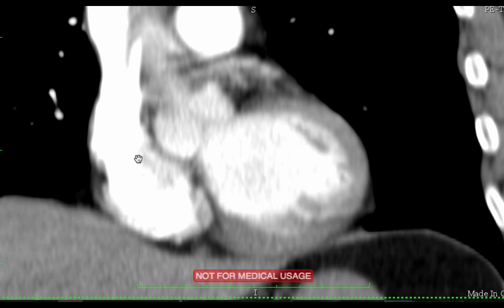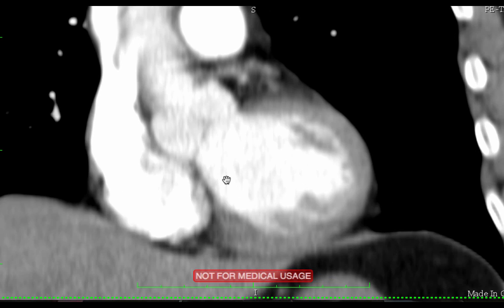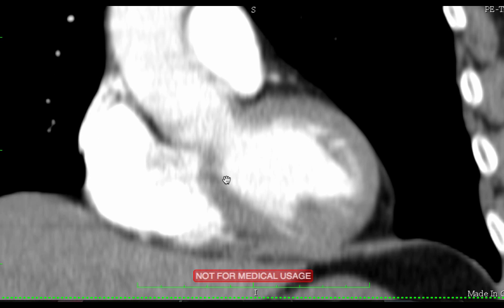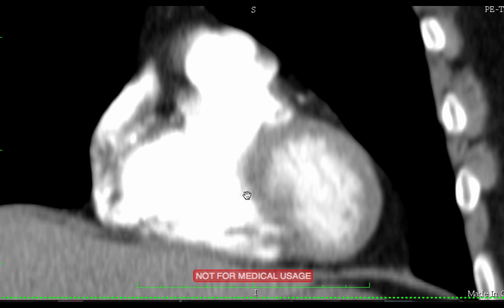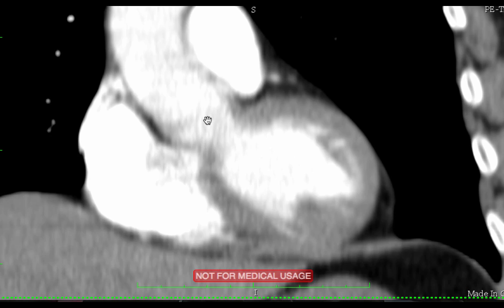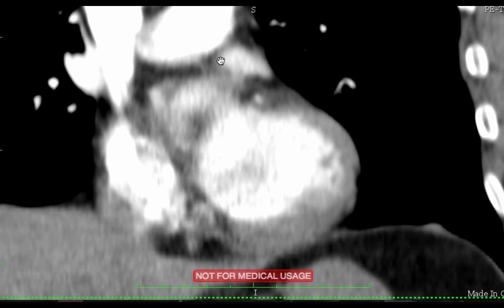This is contrast-opacified blood in the SVC, and it doesn't seem to be going to the left atrium, is it? No, it's going to the right atrium because it's deoxygenated, and it needs to go from the right atrium to the right ventricle and then out the pulmonary artery like this and into the lungs to be reoxygenated.